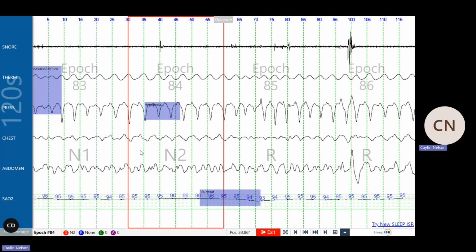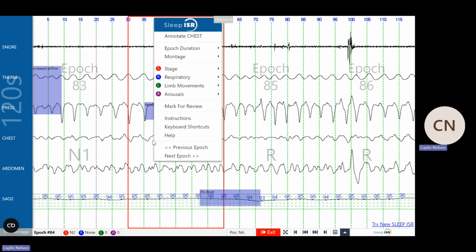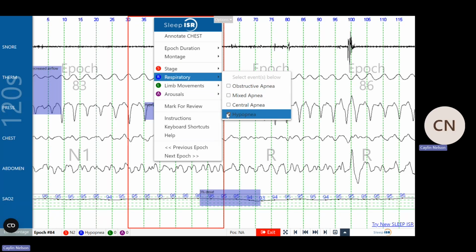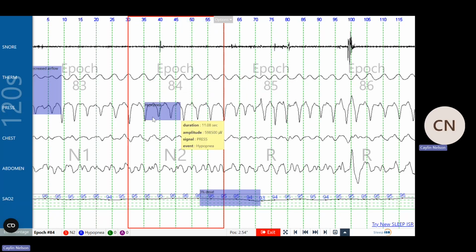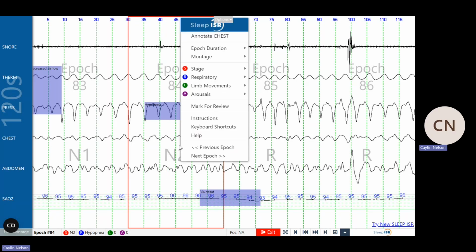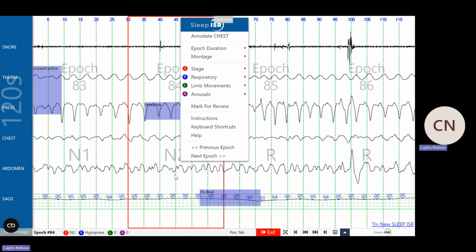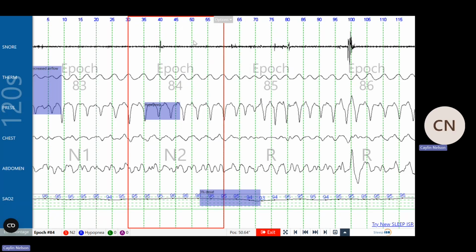So typically how it goes is there's going to be a hypopnea, a moment of decreased airflow, and then it will then be followed, there we go, by your 3% or more desaturation. So your hypopnea is that area of decreased airflow. Again, hypo, low, nia, air. So low air is going to cause that desaturation. So our baseline gets up to 96, and then it's going to drop down 3%, which leads us to that bottom peak of 93%.